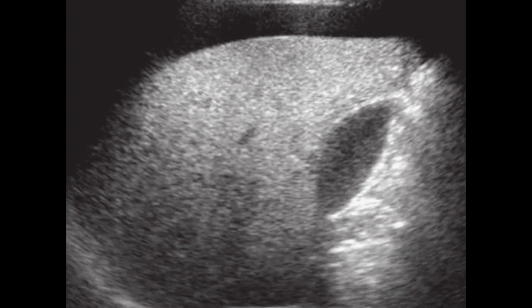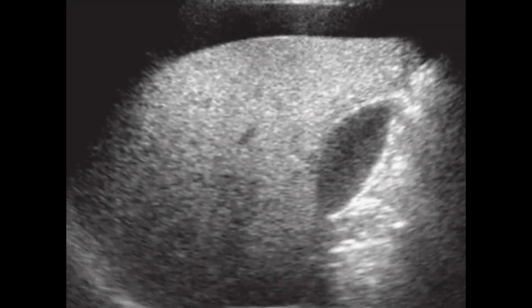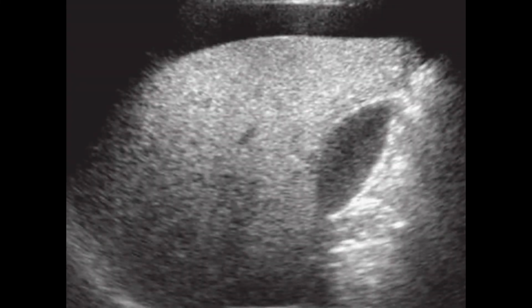Well, the image of this patient shows ovarian hyperstimulation syndrome, and as I mentioned earlier, the term ovarian hyperstimulation syndrome is used when the hyperstimulation is accompanied by fluid shift. Clinically, there are three categories of ovarian hyperstimulation syndrome. They will be described as more than 12 centimeters in the severe form. There will be fluid imbalance, there will be electrolyte imbalance, and there will also be fluid within the peritoneal cavity, which usually resolves within 2 to 3 weeks. But during the scanning, you will see a lot of fluid in the abdominal cavity.